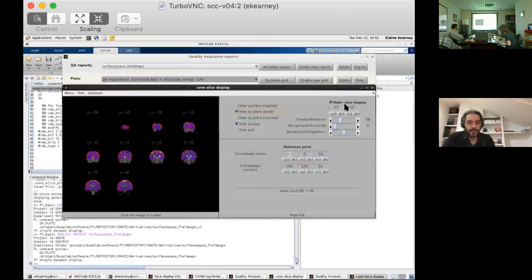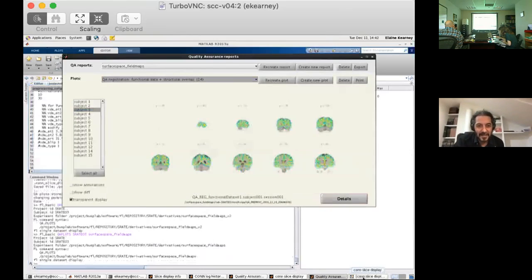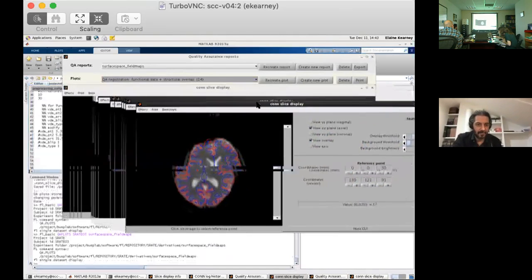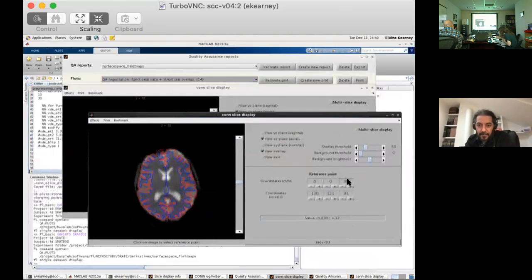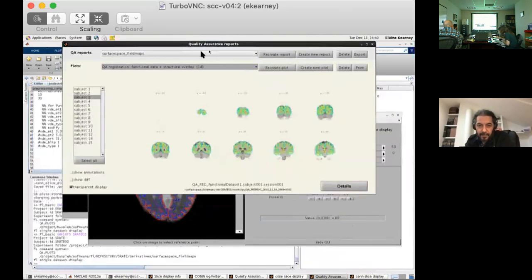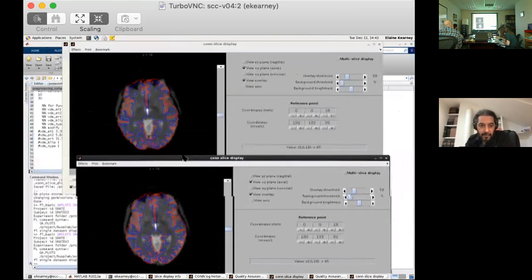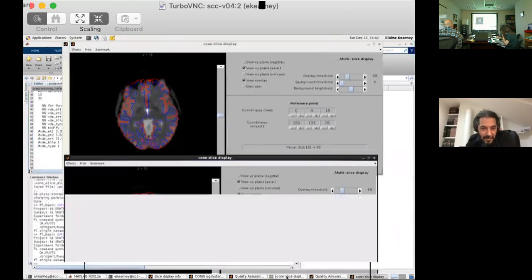They need to be exactly the same, because the front orbit is not real. Yeah, that is one possibility as well. Okay. It's not the same. I don't know which one is which, but the bottom is the new one, right? Or am I wrong?